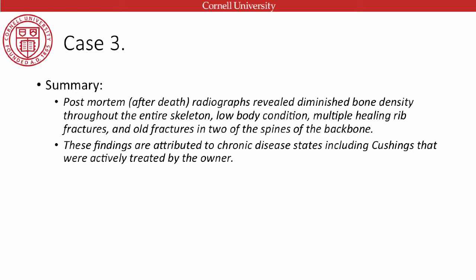This is an interesting case, I thought, because the dog was there for disposal, but the veterinarian clearly was concerned that there was something more going on by the body condition of the dog, and took the liberty to take radiographs before they sent it to cremation. So I'm not sure what the legal standing of that was, but yeah.